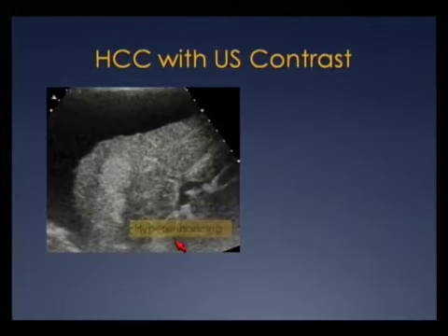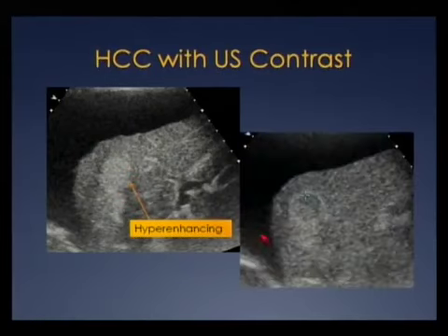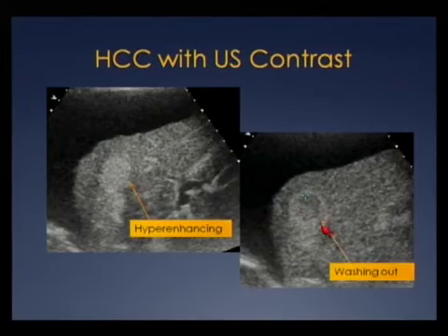Now here's a nice example of a patient we did experimentally with some ultrasound contrast. In the early phase there was hyperenhancement like there is on MRI. In the more delayed phase it washed out with a little bit of residual enhancement of the capsule, another HCC in this patient.